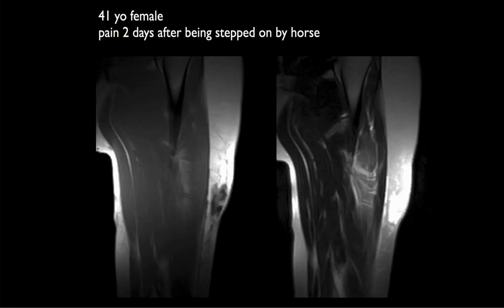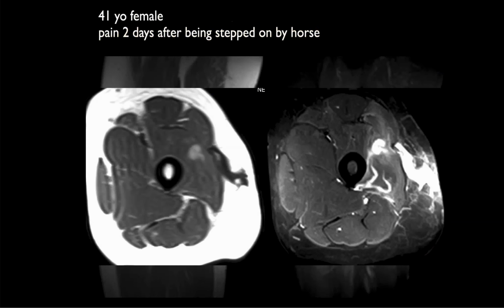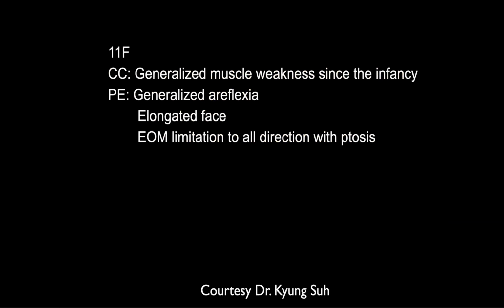We have a 41-year-old female, pain 2 days after being stepped on by a horse. Looks like there's a lot of edema within the musculature and superficial, looks like a fluid collection, maybe a hematoma there. Okay. Yeah, similar here. It looks like an intramuscular hematoma. Yeah, maybe a defect in the fascia there peripherally and some fluid extending peripherally. Yeah, so that was a crush injury. So you can have direct trauma injuring the muscle, not associated with sports imaging.